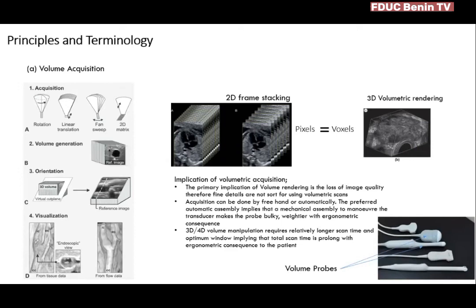Once acquisition is complete and the volume set is being generated, how we view the 3D image is up to the operator to decide. So this introduces the subject of the modes of image visualization, which I'll be talking about in a minute.